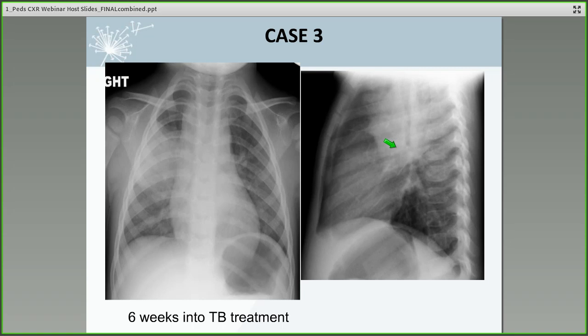And it is a common situation in pediatric TB that you get lymph node enlargement in particular during the course of treatment, and it's associated with immune reconstitution. And as Dr. Vu said, we can't tell for 100% in this case whether there's any enlargement of the lymph nodes because that adjacent consolidation is a similar density. But if I'm convinced that the child has a significant increase in their lymph node size, I usually conclude that it's the IRIS phenomenon, the immune reconstitution inflammatory syndrome, which we think of more in HIV disease, but is well known in pediatric TB in particular.